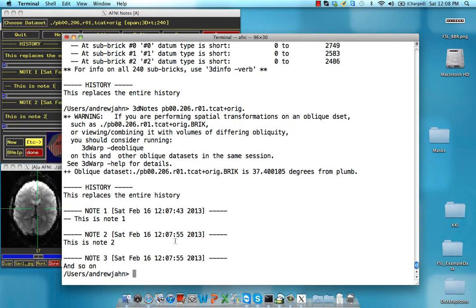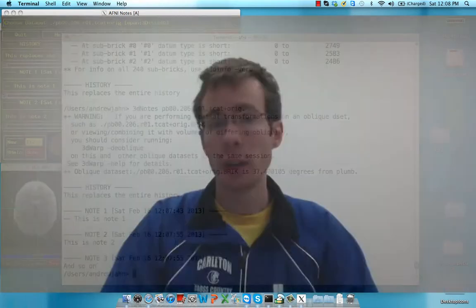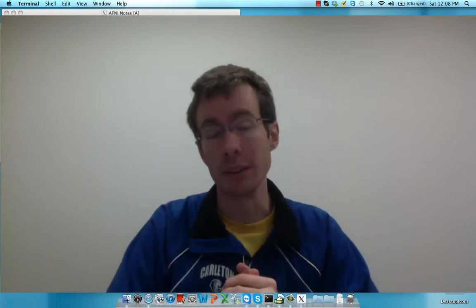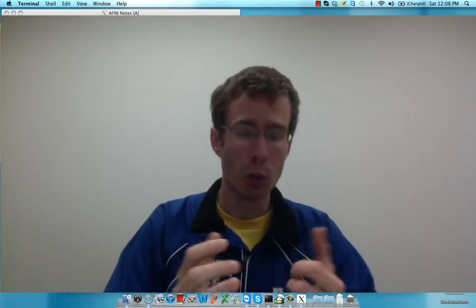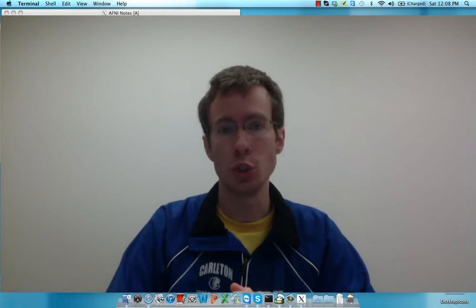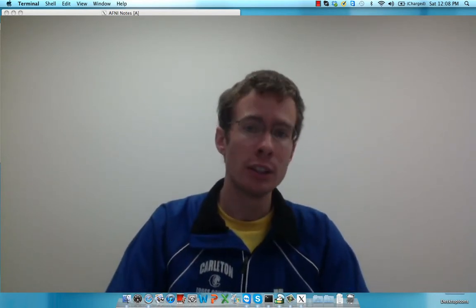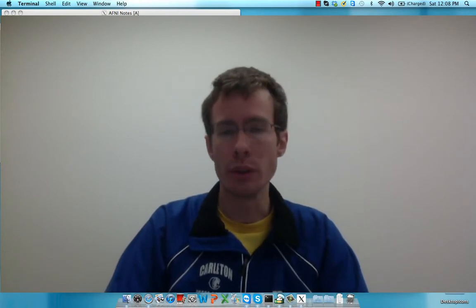Okay? So staying organized, it's very crucial, but it's also very difficult because we are very lazy. But 3dNotes, I hope, will give you a good way to accurately append notes in plain English about what you did, and so that you can retrieve them easily.